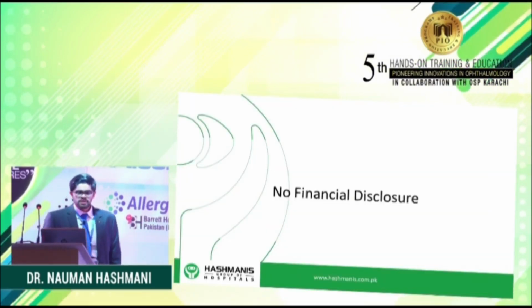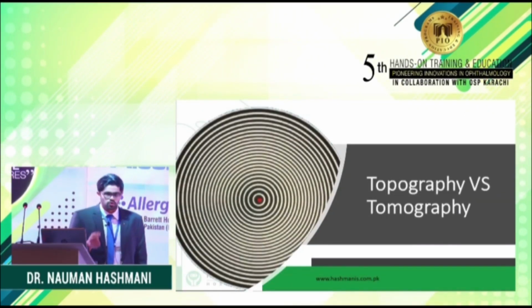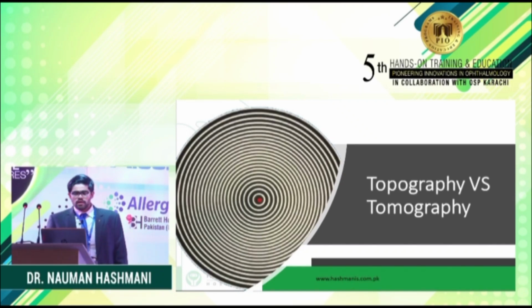Right, so the first thing I wanted to focus on is the difference between a corneal topography and a corneal tomography. Even something called a corneal topography is a misnomer. I won't get into that, but topography is basically an analysis of only the anterior curvature of the cornea, and mainly these are Placido based. So you're shining light onto the eye, taking the reflections from the eye, and analyzing the data of that reflection.